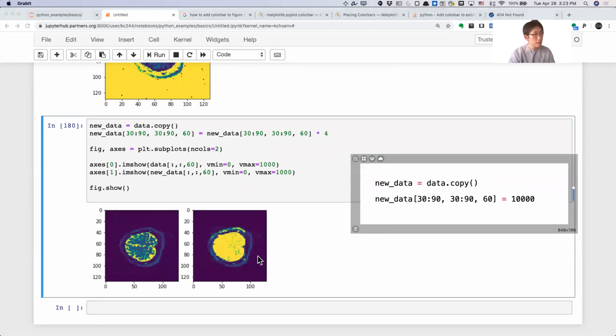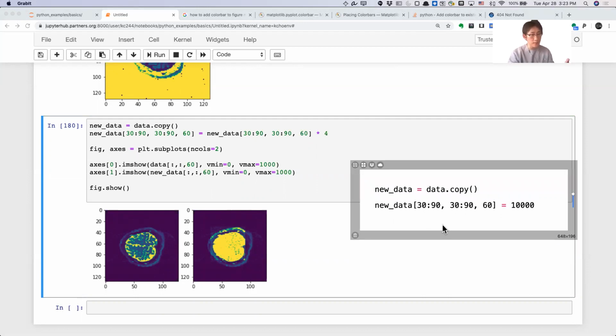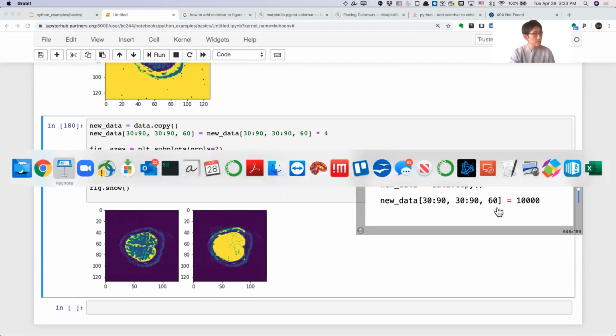All right. Now you understand the brain images that you get in Nifty format are literally numbers arranged in an array. So you can change the values, you can rotate them, you can plot them, you can plot density graph, histograms, and stuff like that. So they are an array.